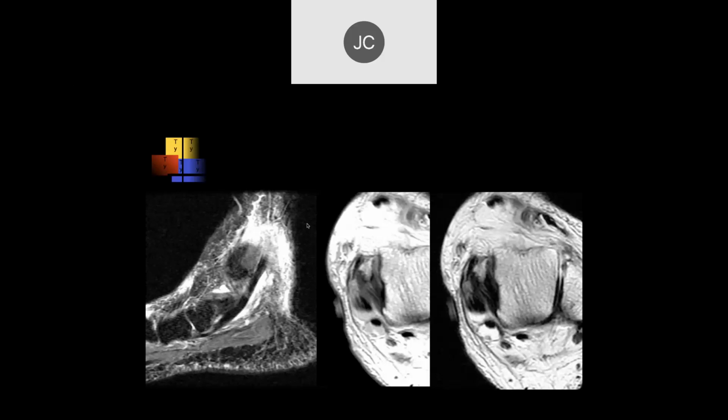Okay, so we're looking at the posterior tibialis tendon. On that sagittal view, maybe a little tendinosis, surrounding edema, maybe tenosynovitis. And here's the axial view: hallucis longus, digitorum, posterior tibialis tendon. The tendon looks intact. Is there some osseous structure anteriorly? Here's a marker where the pain is.